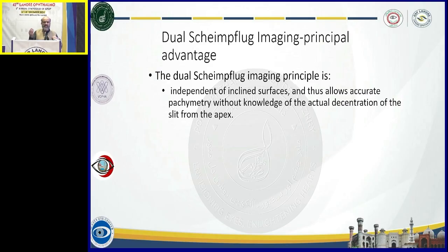It is a simple thing that when the visual field comes, dark is absent visual field and white is present visual field, and the darker it is, the more the impairment is. But that's a very simple thing, if you really know the segments of the visual field, the reliability criteria, the kind of artificial intelligence used.